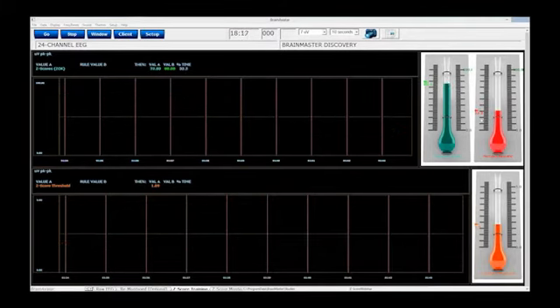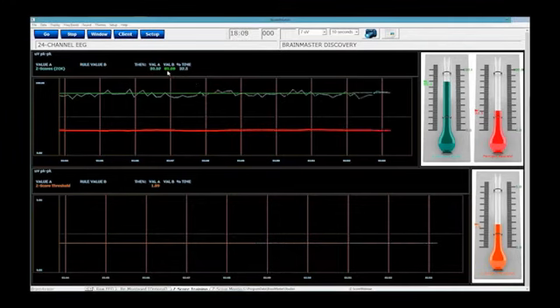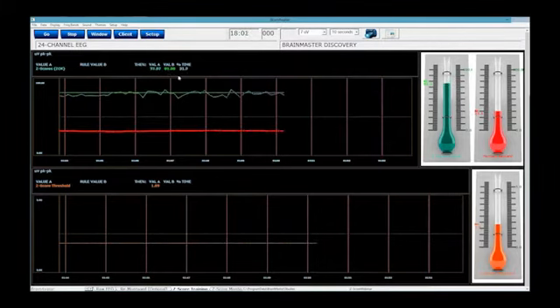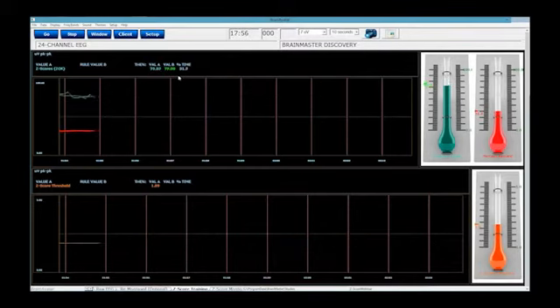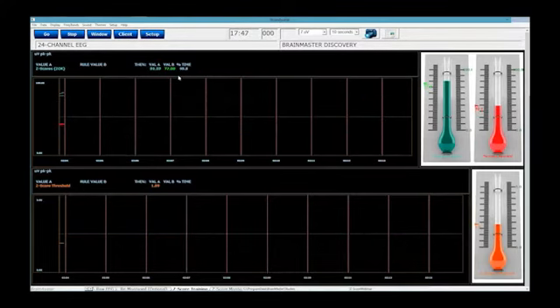And of course you can adjust that, or you can make that easier on the person with the C key right off the bat. If I hit the C key one time, you're going to notice that right here it has increased by 1%, or the amount of Z-scores that we're looking at by 1%. If I hold the Shift key down and hit the C button, it is going to lower it by 1%. If I continue to hold the Shift key down and hit the C, I can continue to lower it. Or if I just let go of the Shift key and hit the C key a couple times, it'll basically bring it back up.